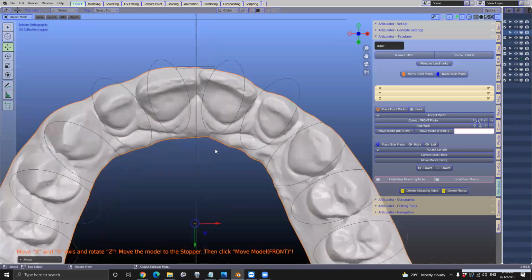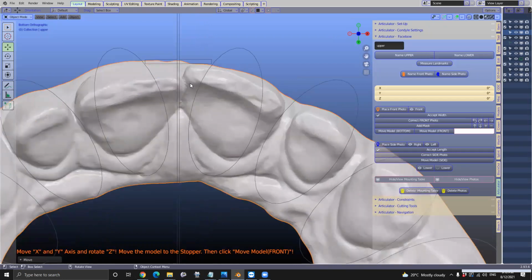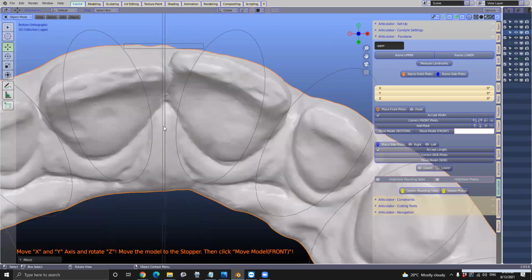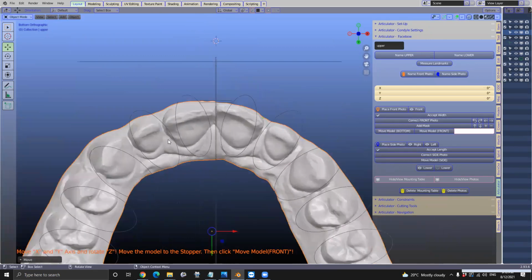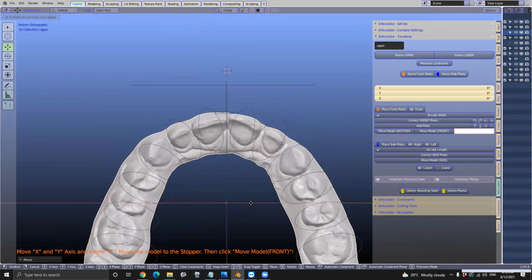The midline is very difficult to see because these teeth are overlapping. So when I'm taking a landmark, I'm looking at this papilla region. I don't want to put it like this, for example, because it is out. So it becomes a little bit tricky, and it's a little bit of guesswork as well. So we're going to put it like that.